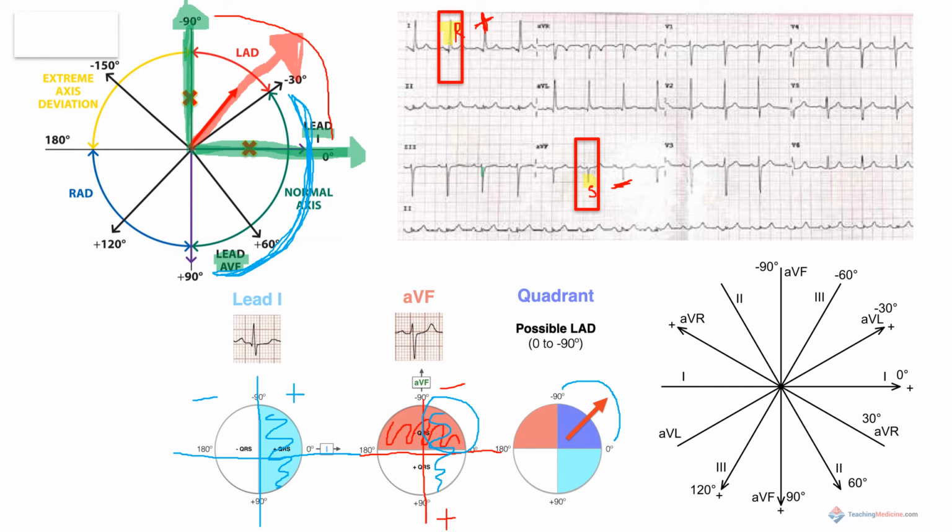Based on this information from our EKG, we know that we are somewhere right here, anywhere from 0 to -90.